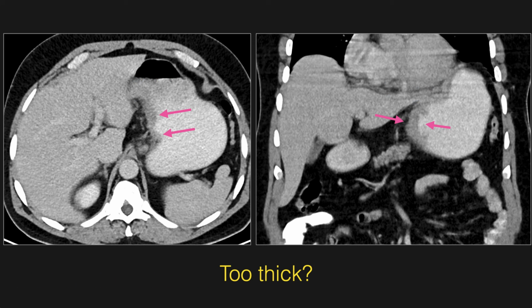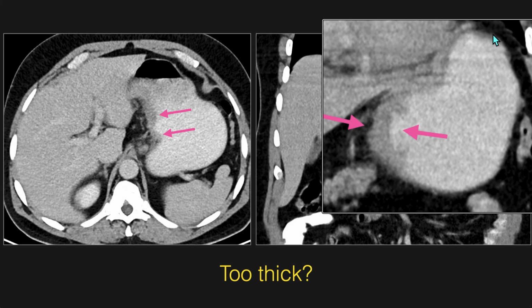Let's wrap up adenocarcinoma with a slightly more subtle case of wall thickening. Remember that adenocarcinoma will usually leave some clues. So what do you think? Is the lesser curvature a little too thick, or is that just due to underdistension? Notice how it looks more soft tissue attenuation than low attenuation or edematous, and that the stomach is pretty distended with oral contrast, particularly when you compare the coronal image, where the greater curvature is thin and the lesser curvature becomes quite thick, even with an irregular border.